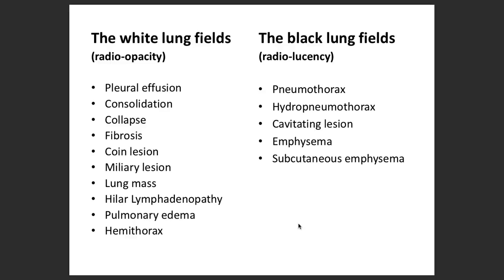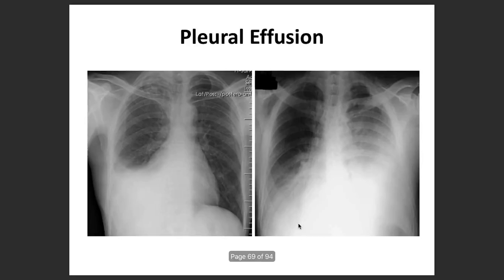So let's first of all have a look at the pleural effusion. I already showed you some of those examples. So what do you notice over here? Anyone would like to describe? Try. The costophrenic angle is gone. Gone where? We cannot see the costophrenic angle. Okay, good, good, good. So this is how you will describe the X-ray. I taught so many shortcuts as well. Okay, good. That's good thinking, in fact. I really appreciate it.